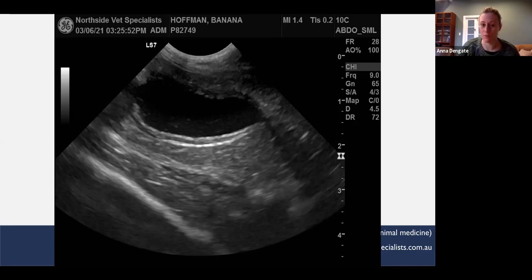And we certainly see gallbladder wall edema or changes like this, particularly where you see that gallbladder wall, and this might just be an artifact, but it looks a little bit irregular there as well. If there's other signs of active inflammation in the gallbladder, like a little bit of free fluid at the neck of the gallbladder, or a little bit of hyperechoic or mineralized sludge, that would add weight to a local inflammatory process rather than anaphylaxis or pericardial effusion as a cause of these changes.